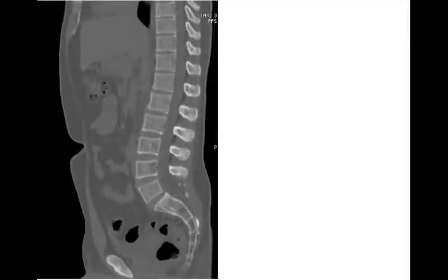Okay, so sagittal CT of the spine. See this corduroy appearance to the vertebral bodies. It's kind of repeated down. So this patient had multiple hemangiomas. So one of these is typical of a hemangioma. They just happen to have multiple in their spine. They were asymptomatic from them.